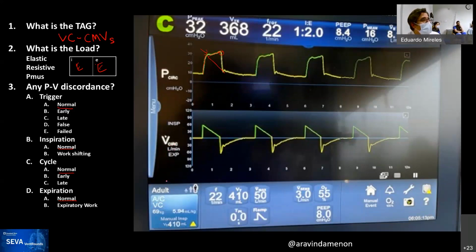The exhaled tidal volume is reading lower than set. There you go. Thank you, Aman. So you can see here, the tidal volume is 368 and the set tidal volume is 410. Isn't that psychotic? So now you have a difference in tidal volume expressed here. Evidently, you don't know how much is going in. There's a screen where you can see the tidal volume that has been inspired. But in other ventilators, and that's why I put screens and scales, you can see both the inhaled and the exhaled tidal volume. So there's a discrepancy in tidal volume.